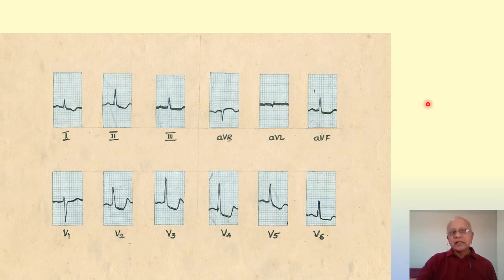Now, as the patient had exertional angina and came to the OP climbing a staircase of 2 flights of stairs, the ECG possibly shows the changes of inducible ischemia when the patient's ECG was taken. So it is like doing an exercise ECG for the patient. Really, this ECG was of a patient with angina.